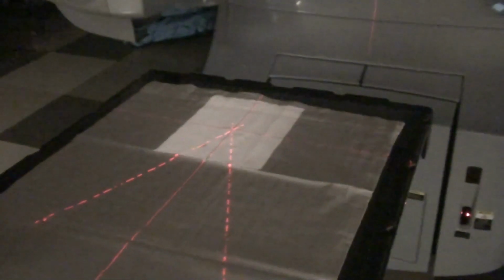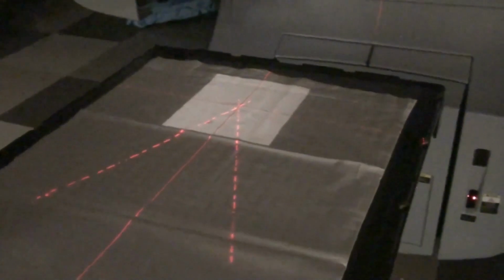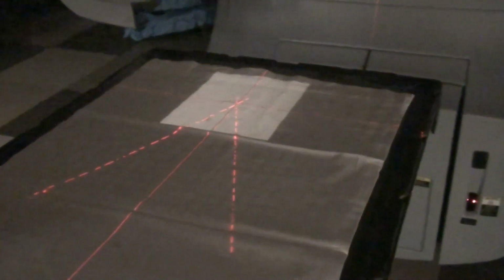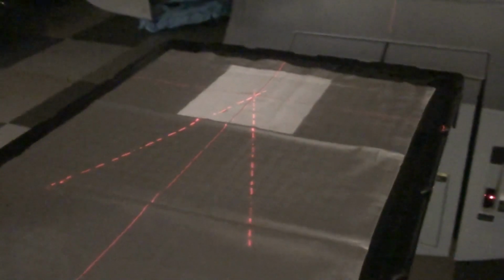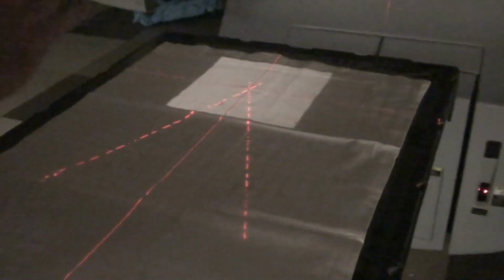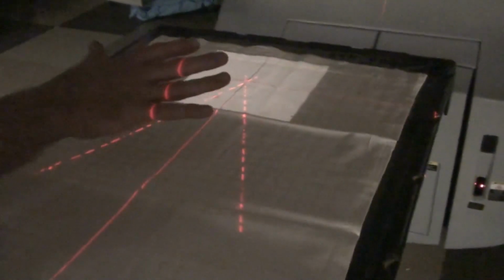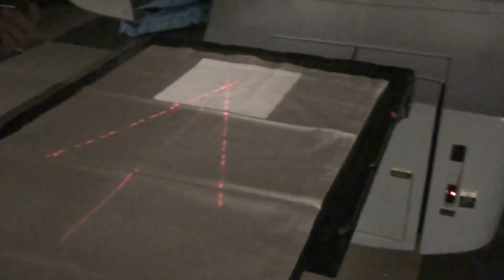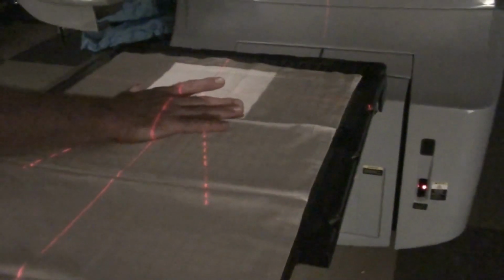The radiation beam is defined by a manually adjustable slope-sided collimator assembly. This collimator allows a fixed rectangular field to be obtained. Point detector techniques and the F5 tally are used to calculate the gamma ray flux at different points in the path, and the ANS photon flux-to-dose conversion factor is used to determine the dose rate. 10 million photon histories are used to accumulate the tallies, which are normalized to the cobalt source.